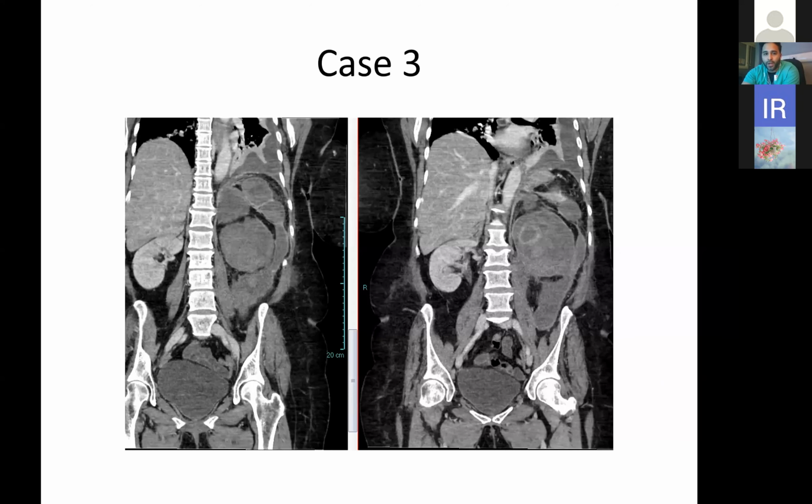So I think this lady did have long-standing renal problems. I think they had PUJ stenosis, with a background history of diabetes and things like that, and just recurrent infections involving that kidney, obviously with time has just resulted in this kind of pus forming collection. That was quite complex. So yeah.